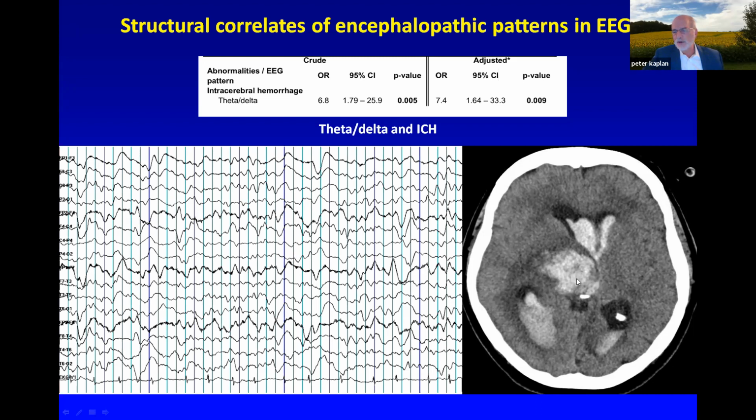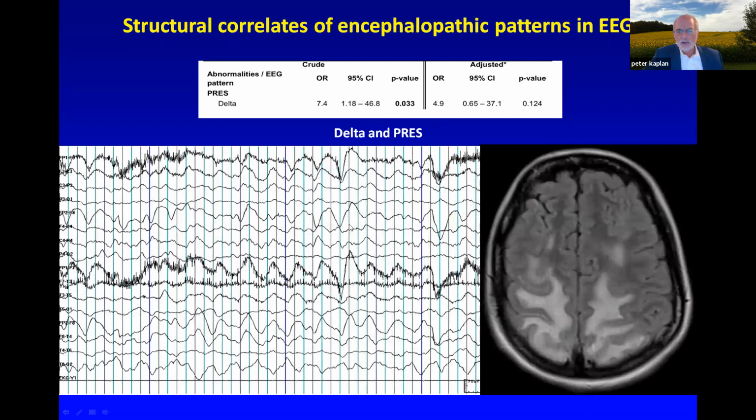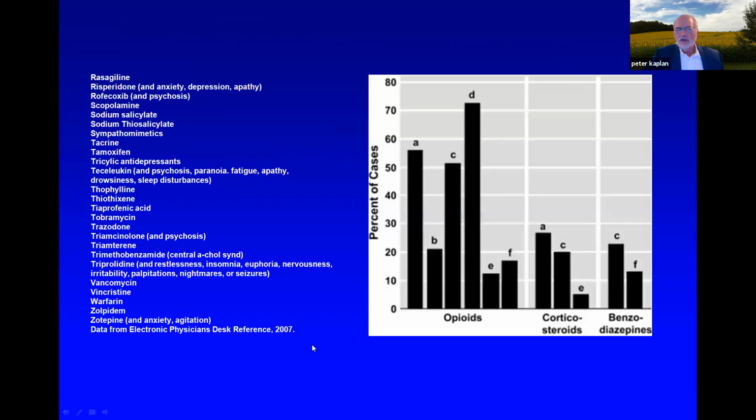So in a way, you can follow the patient in some aspects with an EEG, looking for change in compromise, because this reflects typically the level of consciousness. Imaging does this indirectly, but is not a direct measure of metabolic function. Here you have PRES and white matter disease, and there again you can see high voltage delta intermittently as the reflection of the subcortical compromise. Here you have that very focal ischemic stroke, and that's where you get the intermittent rhythmic delta activity that you can see here.